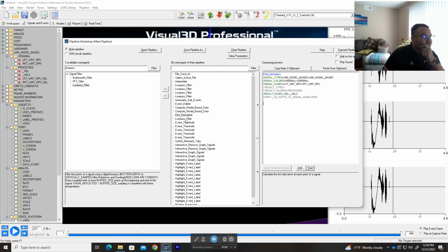That's why I said, if you're trying to run very high end models and you're having troubles finding it, although as far as I've tried, I've been able to do everything in here, unless it's a specific library that I can only use in MATLAB or any other coding languages. Then I export the data from here, put it on MATLAB, and do it there.